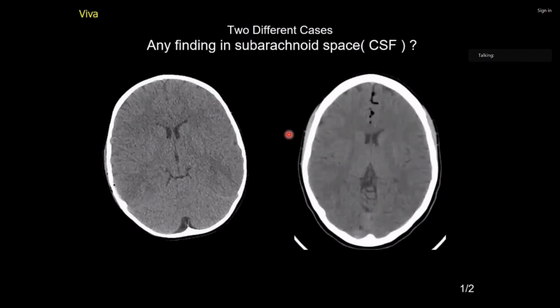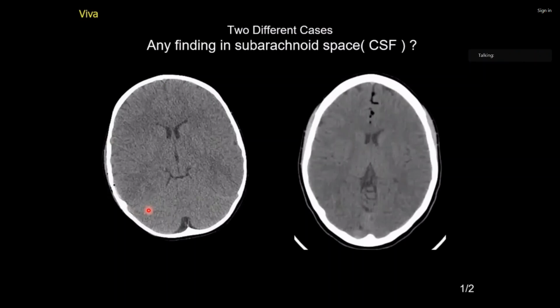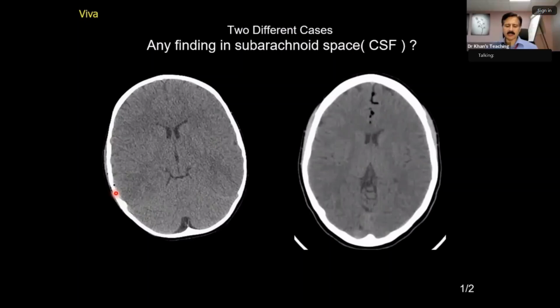On this one it is different, and this is different. So is there something in the subarachnoid space on this scan? There is a locule of gas. How will you confirm this? I would do a bone window, and then check for the fracture, for pneumocephalus. My question is more basic than that. So you are absolutely right. You will go for bone window, you will look for an associated fracture.